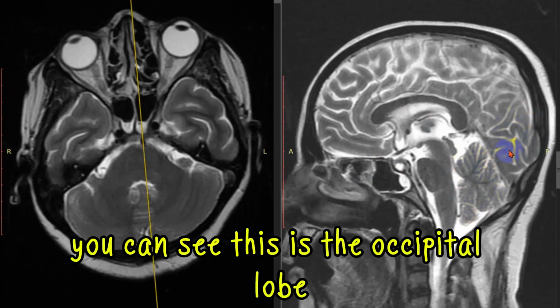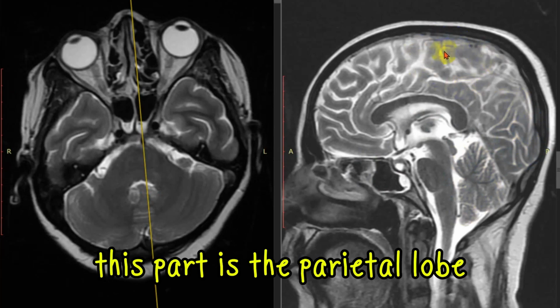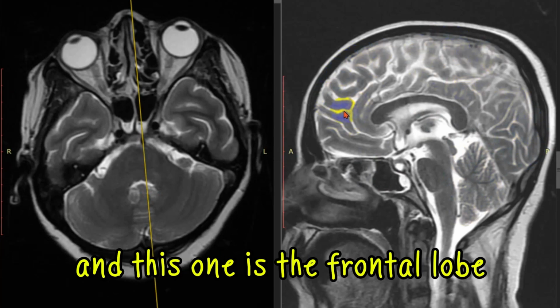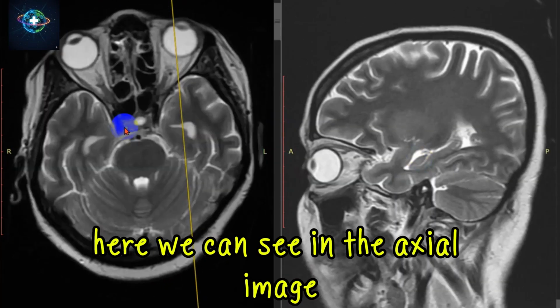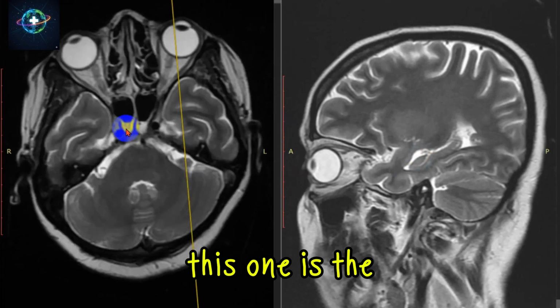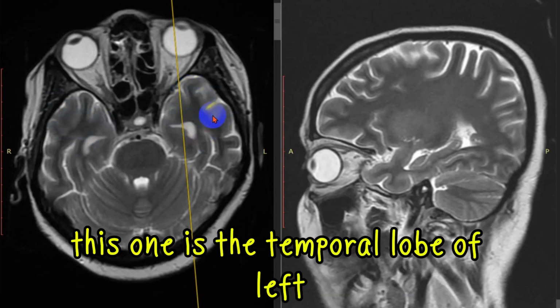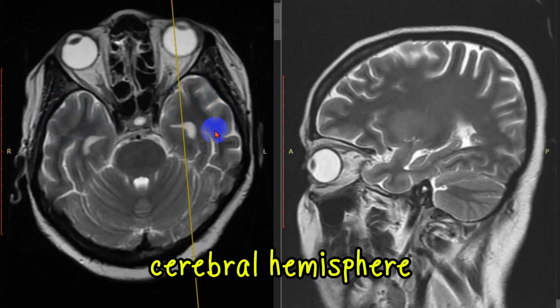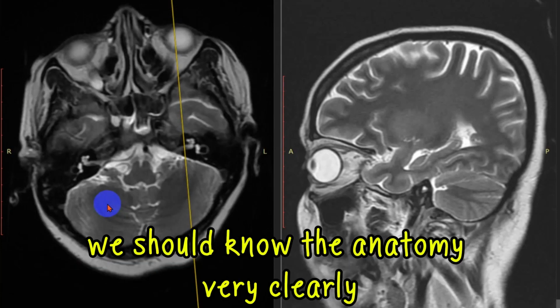This is the occipital lobe. This part is the parietal lobe, and this one is the frontal lobe of the cerebral hemisphere. Here we can see in the axial image, this one is the temporal lobe of the right cerebral hemisphere. This one is the temporal lobe of the left cerebral hemisphere. So for understanding pathology, first of all we should know the anatomy very clearly.